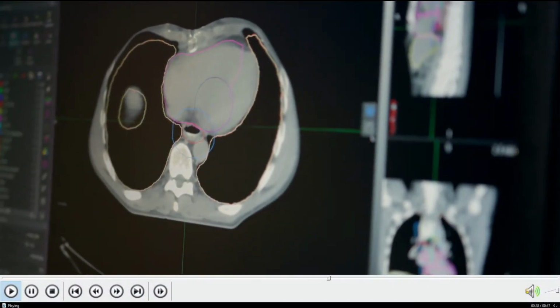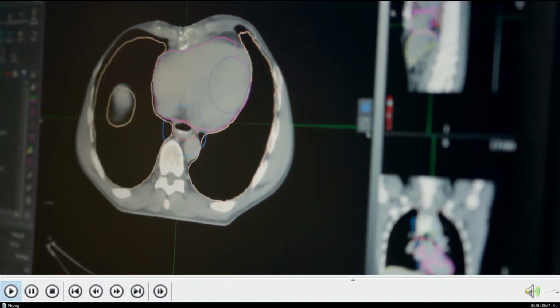The planning of this radiation treatment is powered by medical imaging. So what they do essentially, they take a scan, a CT scan or MR scan, and they need to basically outline every organ that is there to tell the machine what exactly needs to be treated. And I have a little video here, so if we look at it, here's a radiation oncologist planning a treatment of a patient.